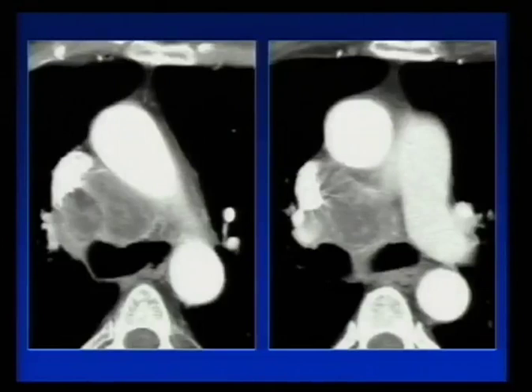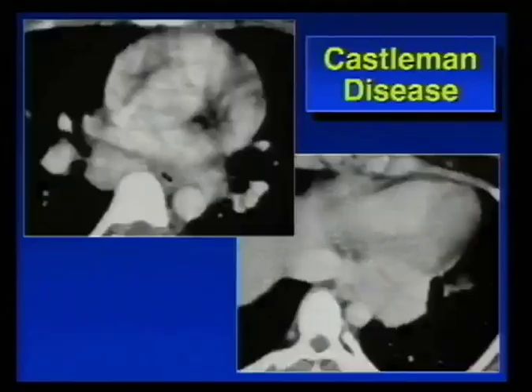How about this? Anything unusual here? Are these low-density nodes? Okay, so we have low-density nodes here. Differential diagnosis is TB, MAC, and metastases, such as from squamous cell carcinoma, head and neck cancer, for example. Certain types of adenocarcinoma, I've seen lung cancer do this, breast cancer, and sometimes renal cell cancer. Not too common, but it occurs. If you see this, give the differential.